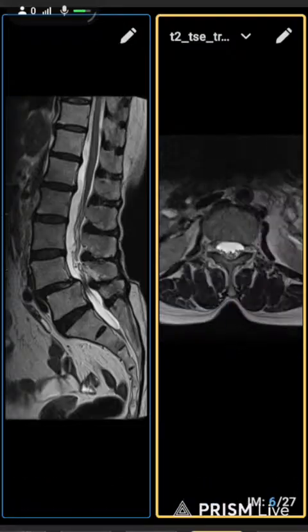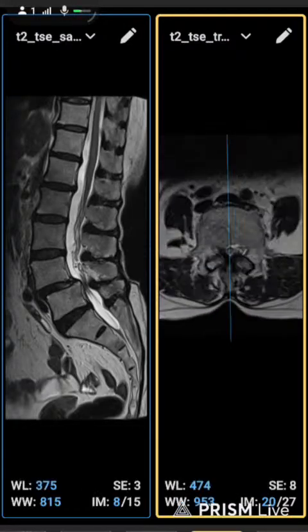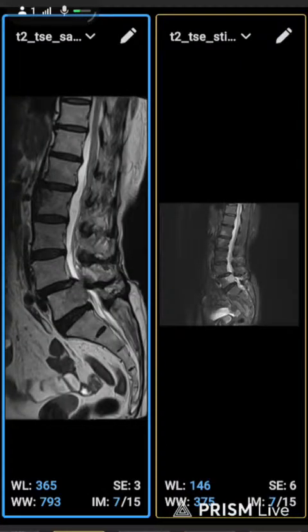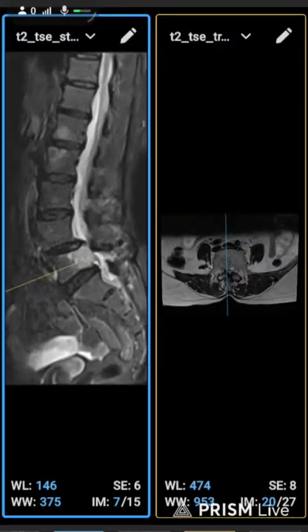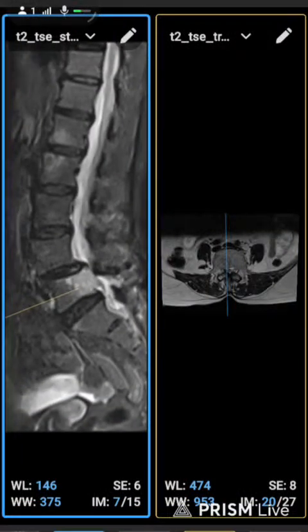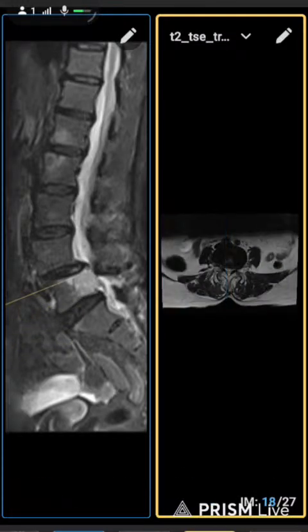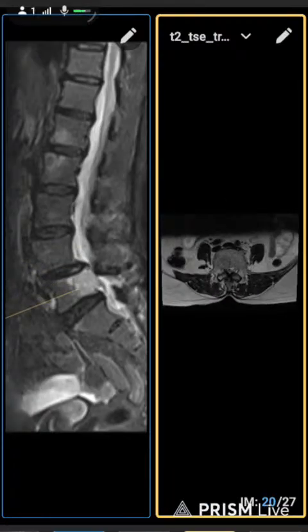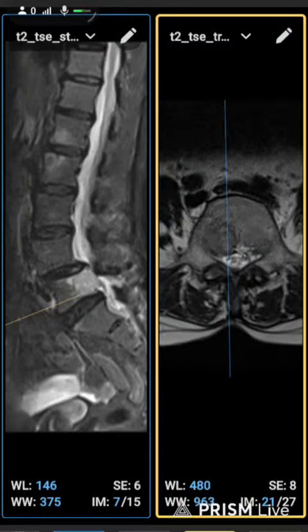So here you can see the axial of the vertebra. Sorry, I will show you the... Okay, today class is ended here. We will describe this patient tomorrow. You will see in T2 the lesion looks like this.